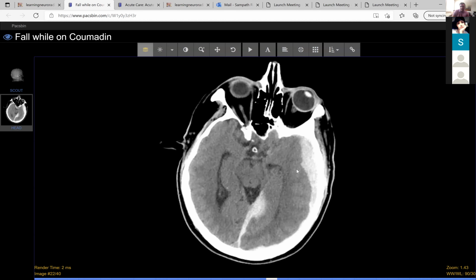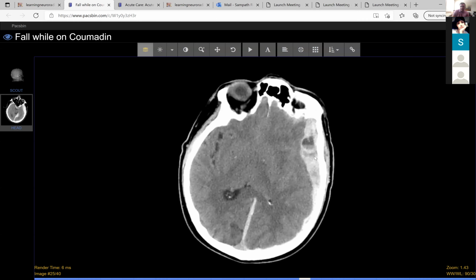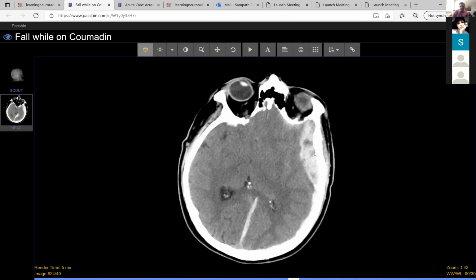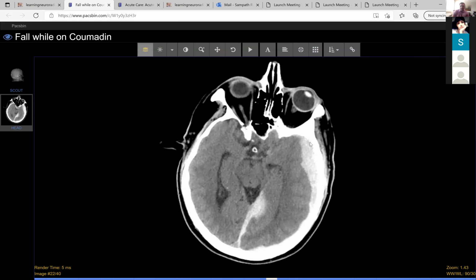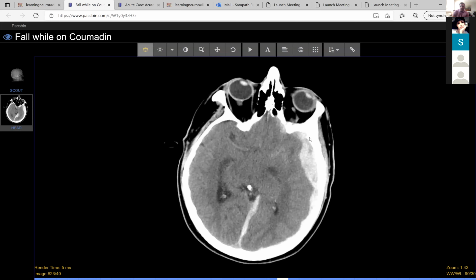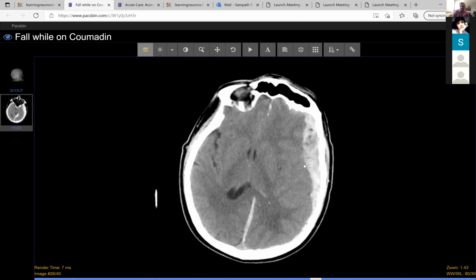This is also a surgical emergency. He needs to go in and have this blood drained out immediately. Once the patient starts to have brain herniation, there's no coming back. You cannot reverse the process, because once the brain goes through herniation, there's nothing more you can do for the patient. So it's critical that you do this way before this happens. Actually, I would say this is a bit too late.